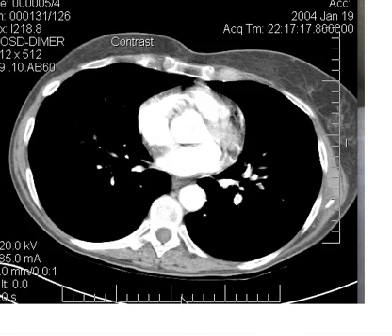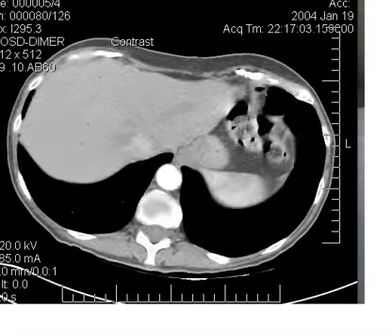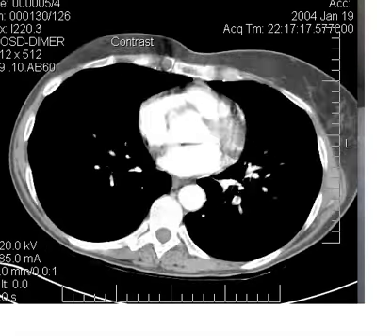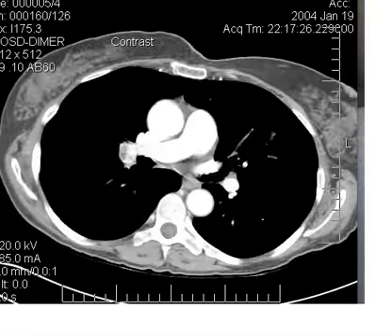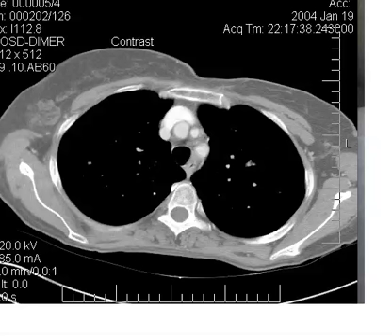Okay, Dr. Dave Mintz here, and I wanted to continue on another case. This is a 71-year-old female with shortness of breath. I'm going to go from the bottom to the top, just to give you an overview, which is what I usually do. Just spin it, take a quick look, see what's going on.